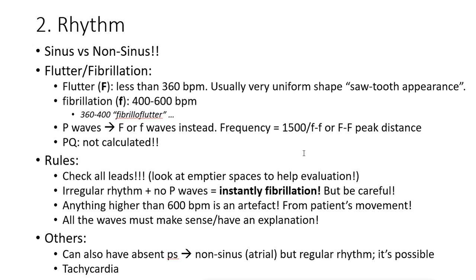There's not that many QRS complexes going on, and that is the best location to check: is there fibrillation or not? Because sometimes the baseline starts vibrating and you're like, okay, that looks like waves. There's definitely not any waves here. What is this? This is actually fibrillation. So be very careful about this point. This is a very golden rule. I really like this one, because look at this.